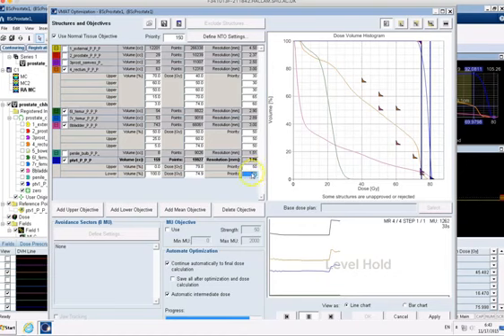So let's let it run at that, and what we might have to do is reduce the priorities elsewhere. Just bumping numbers up doesn't necessarily help. It's very much about, if you increase something, you've got to reduce something elsewhere. You need to be showing it what compromises you're prepared to accept. So it's very much an iterative process. If I was doing this for real, I would spend quite a bit of time, certainly in the old days, a couple of hours adjusting this, and so it might take you quite a while to get somewhere close in terms of deciding what's important, what's not.